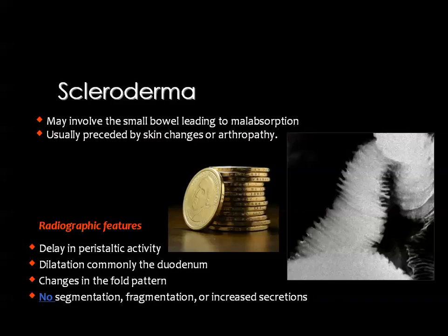And actually, the affection of the bowel by scleroderma will result in some kind of atony and dilatation of the affected segment of the bowel, together with some prominence of the mucosal folds of the small bowel in particular. But this appearance will simulate many other diseases that affect the small bowel, and the diagnosis of scleroderma is reached by the knowledge that the patient had skin changes of scleroderma and maybe osseous changes of scleroderma.